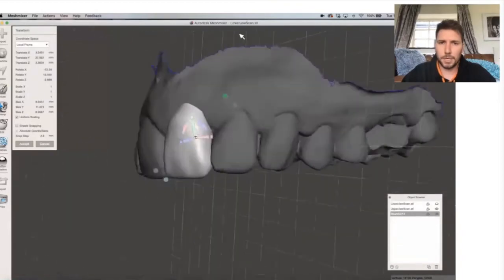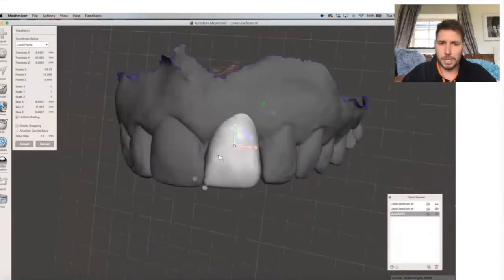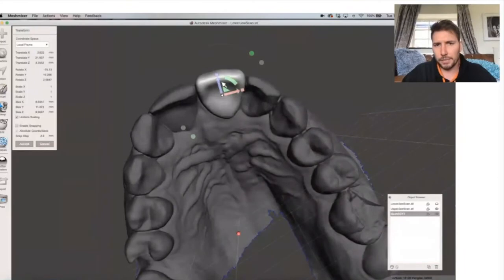Okay. Now, obviously, if I had more time, I could show you. We could also copy and paste this model. There's a function to mirror if you want to mirror it as well. There's a video on the DDA YouTube where I've shown that you can go on as well. But other than that, we've pretty much got that looking nice there.